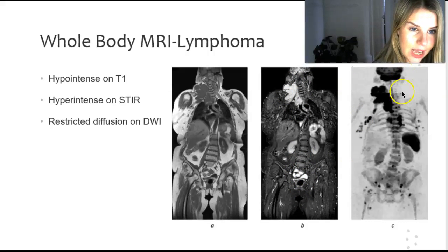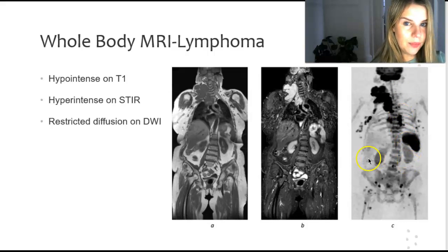And this one here is a diffusion, but don't worry if you're a bit confused by it, because we don't normally see them in the coronal plane, but in whole body we do construct them into the coronal plane. And we also do something called inverting them, a bit like when you can invert pictures on your phone.